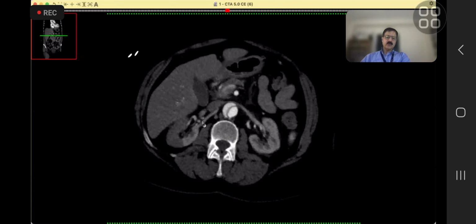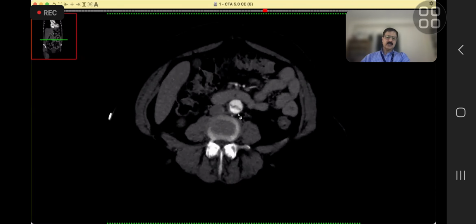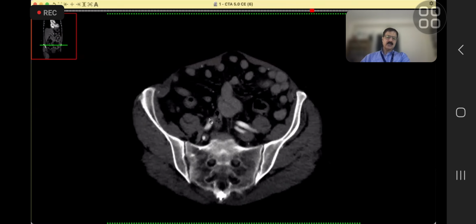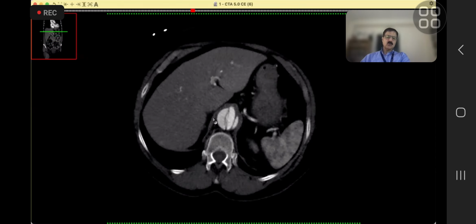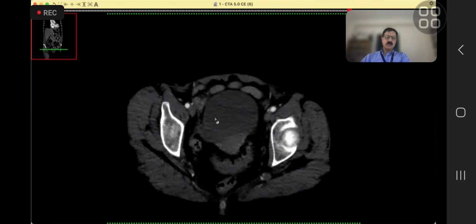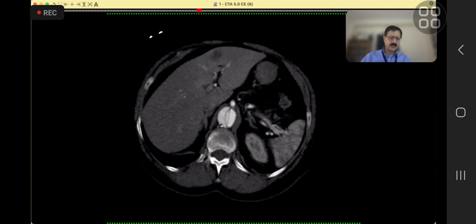That was very well picked up. It was also well picked up that the left kidney is normal, and then the distal extension, where a portion goes into the right iliac. And then the pertinent negatives, as to whether the gut is involved. Overall, this was very well done. Thank you, candidate 2. Candidate 3, are you ready?